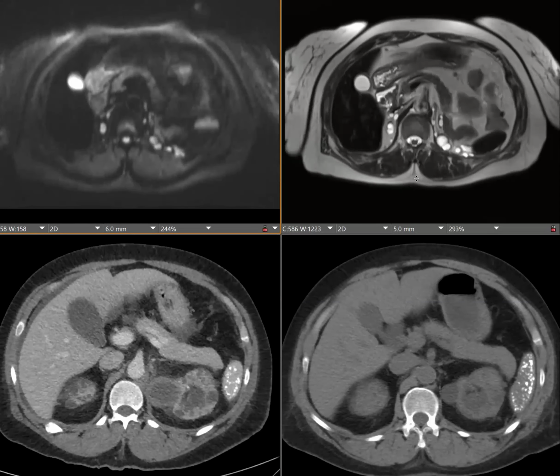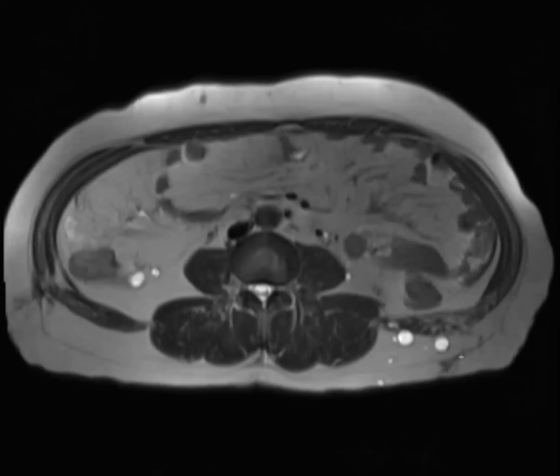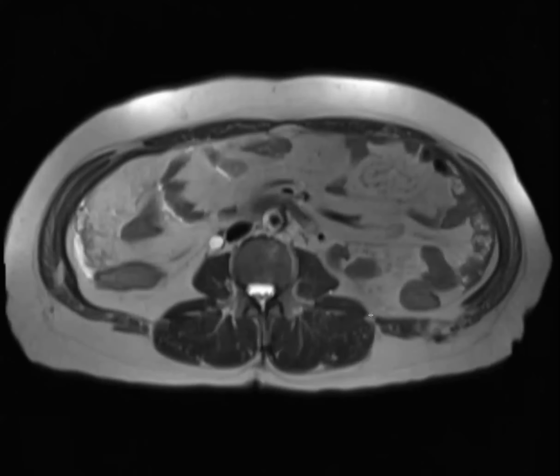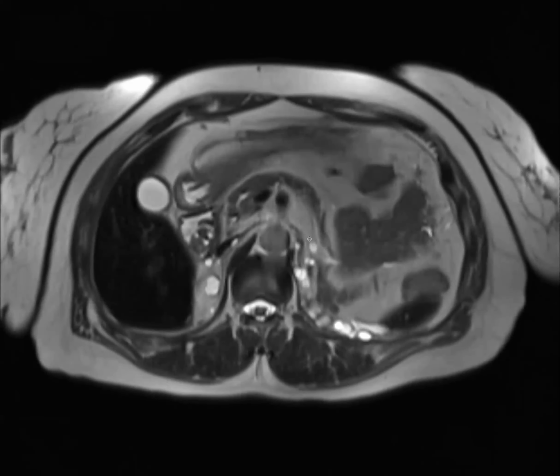She was on peritoneal dialysis. So this is all that we saw. She had serial MRIs. I'm just showing the one that was most concerning, because she started developing 1, 2 cysts in the surgical bed, and then it became more. I'm just scrolling through to show this is her nephrectomy site. She had some similar cysts there. She had some along her surgical bed, and along the course of the retroperitoneum. One of the cysts was resected.